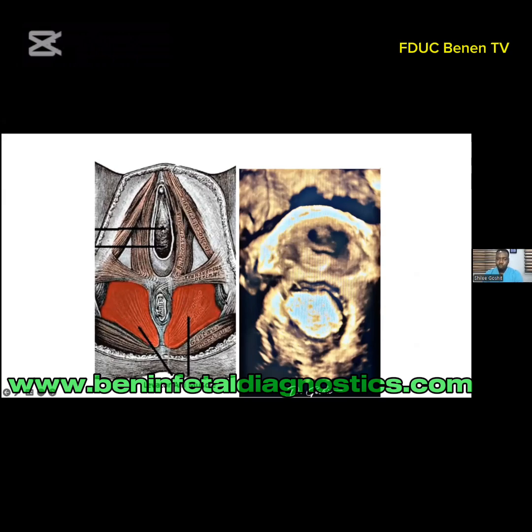On this side, you see how it is attached to the transverse perineal muscle. Everything is fine here. But if you look to the right, you can see that this muscle group is torn. So you know that when you are going to do surgery, based on this image, you just go and fix this right side. She had the surgery, this was fixed, and continence was restored.